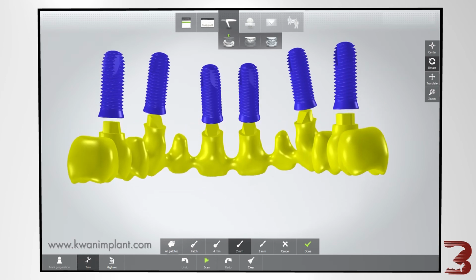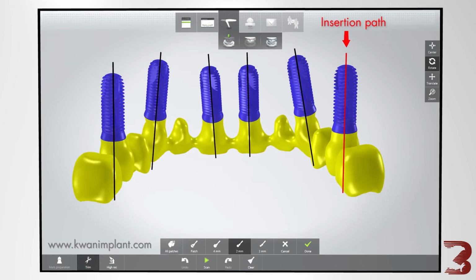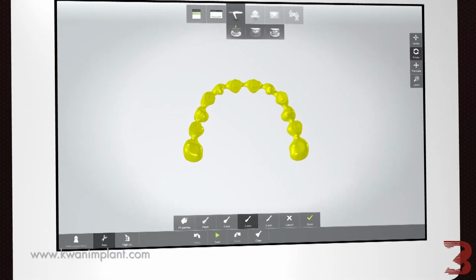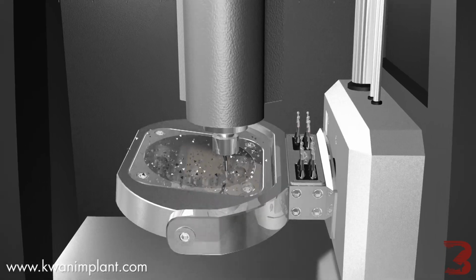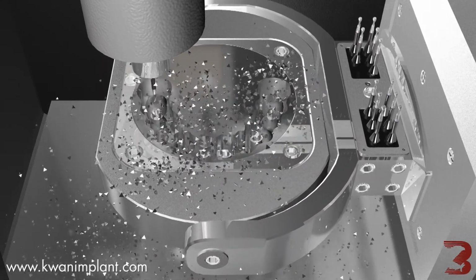This clinically validated method provides a stable attachment of a one-piece implant prosthesis to multiple implants with different trajectories, without any intermediate components between the implants and the final restoration. The computer-aided design dental prosthesis can be fabricated directly from milling blocks of materials, including titanium, zirconia, and other tooth-like materials.